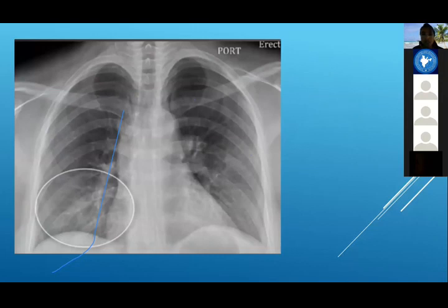Now, coming to the fourth terminology that we have to use, that is a 43-year-old male coming with dyspnea. Here you can see a right lower lobe opacity. In the right lower lobe, we are seeing a patchy consolidation, but the rest of the lungs are clear. So in this case, if you are seeing a focal consolidative patch, we should give the report as chest X-ray focal pneumonia. It can be an early COVID pneumonia or it can be a bacterial pneumonia. We can decide that according to the RT-PCR result and other clinical findings. In this patient, the RT-PCR is positive.